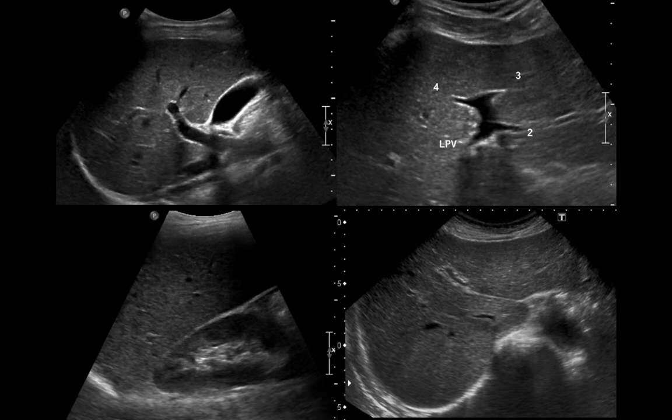It is difficult to define the dilatation of that tube structure. Why? Because for pediatric patients, from the smallest to the largest, you have to memorize the numbers. This is difficult for us. So I think it is easier when you see two tubes of similar size, that means dilatation. For adults, it's easier: 7 to 11. For non-operated patients, we just remember 7 millimeters. For those operated patients who had a cholecystectomy, we remember 11. But for pediatric patients, it is easier to visualize the tubes.